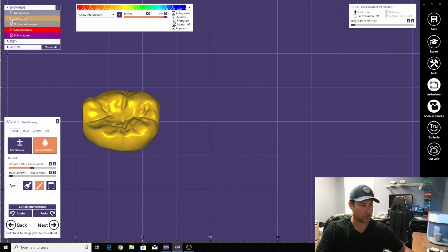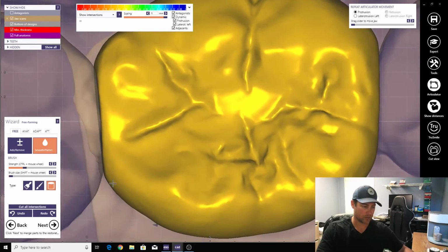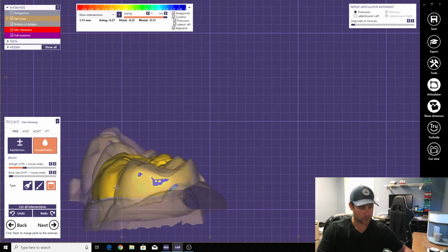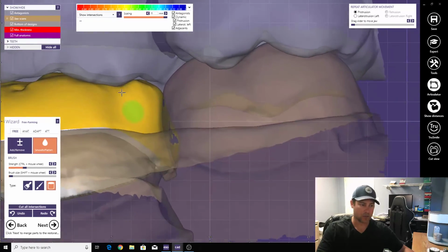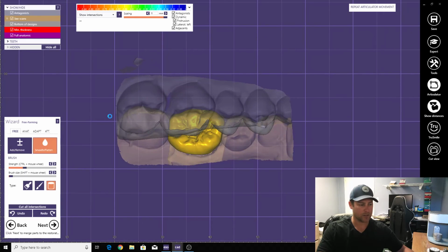Alright. Take one last look around. We can smooth this up with the cylinder. You want to do that? Go ahead and take a look around. Everything looks pretty good. Check the occlusion. Nice stuff to smooth that up right there. Here. Alright. And then you're done.